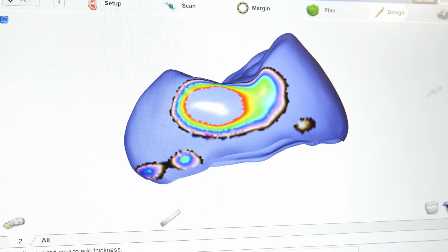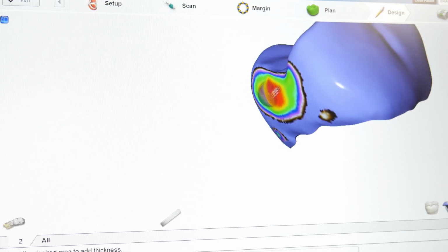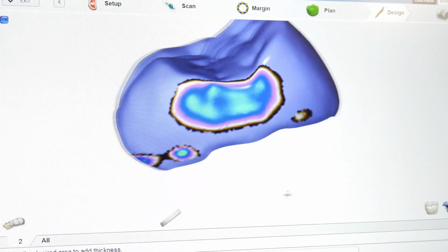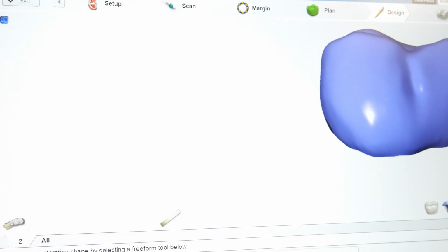So this is obviously very heavy, but we're going to bring it down to just a little bit of aqua. And I like to use the dropper tool, but in a negative aspect. So we're taking away rather than adding. Almost there. Good, just a little bit of aqua. It's looking good.